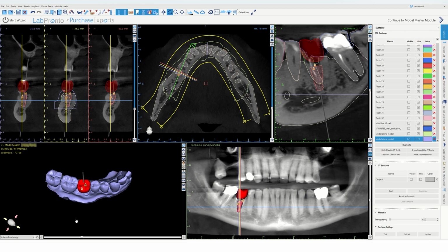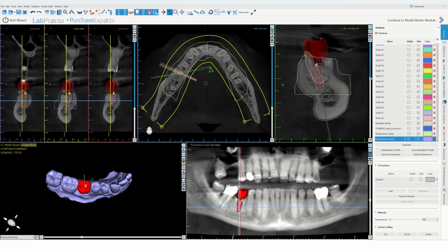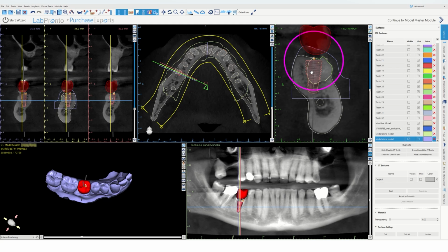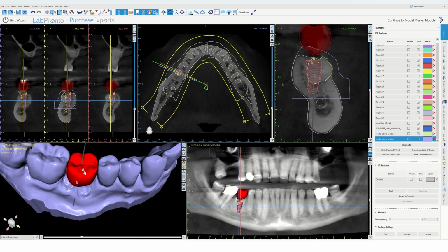Okay, right now our implant path is a little bit distal. Let's fix it. We're also pointed a little bit lingually. So let's go in the buccolingual view and straighten this out if we can. Now we might need to go to a 5x8. There's no shame in using a 5x8 implant. Yeah, that's a pretty good position that I see over here, but let's see. Let's do our spin around.